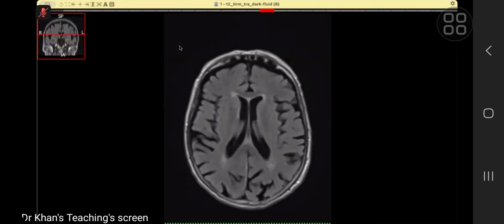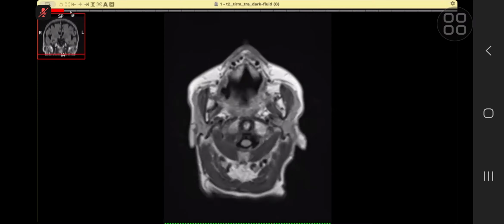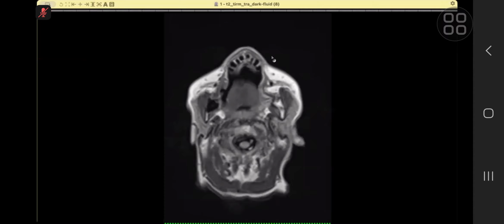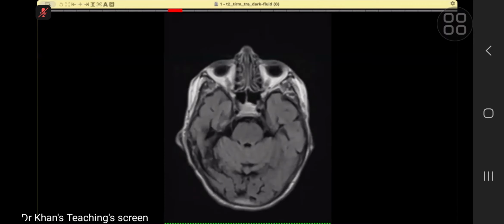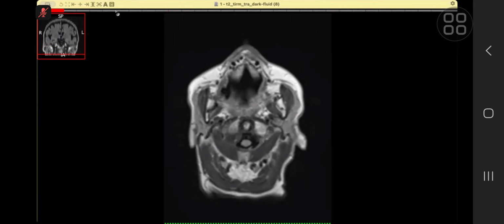Okay, fine. Now, people were not very convinced. They took your opinion, and they did an MR. Over to you. Yes, sir. These FLAIR axial images have been provided. So I'm just scrolling through the images to the abnormality which you picked up.